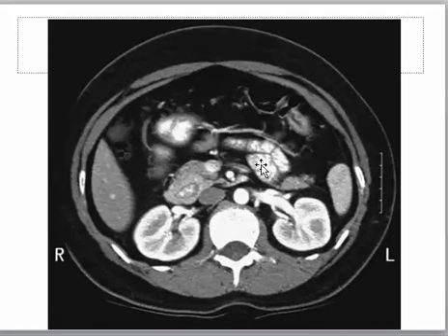Now this is contrast within the duodenum, intestinal loops, jejunal loops, and duodenum, and this is contrast in the duodenum, which is enclosed by the head of the pancreas, and this is the appearance you can see in cases of annular pancreas. IVC, aorta, and head of pancreas, and this is the part of the duodenum within the head of the pancreas, annular pancreas.